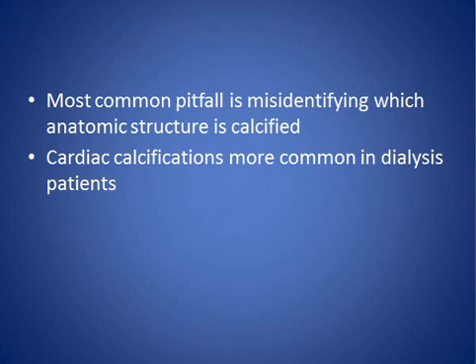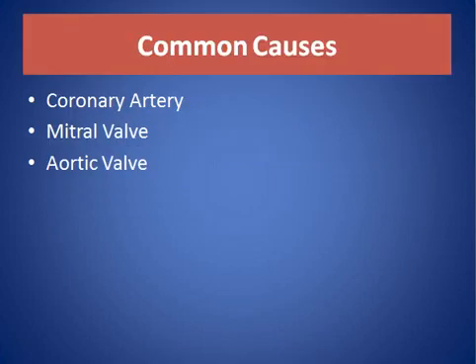Most common pitfall in misidentifying which anatomical structure is calcified. Cardiac calcification is more common in dialysis patients. Common causes of cardiac calcification involve the coronary artery, the mitral valve, and the aortic valve.